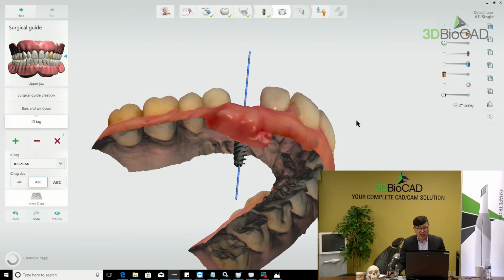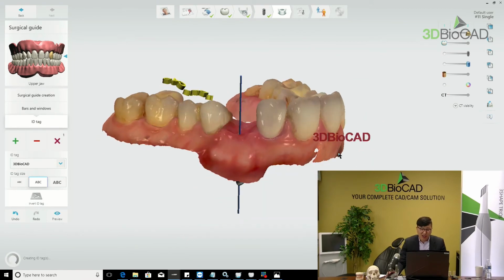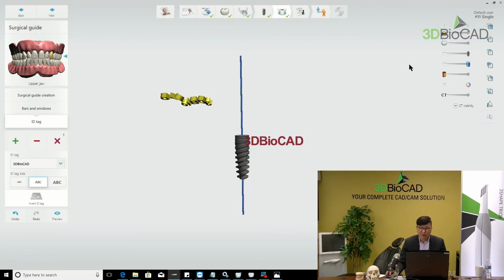Implant Studio and Dental System come from 3Shape, we already know. So it's the same company's software. Once we are done with implant planning and designing a surgical guide, this scan file plus this implant position becomes one.